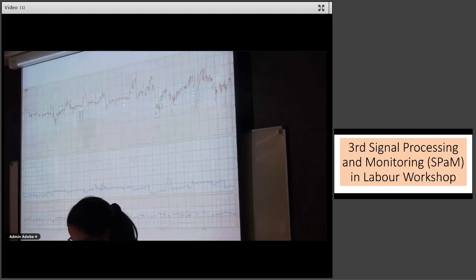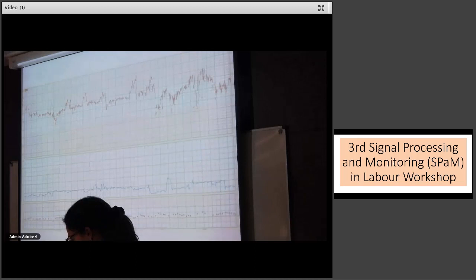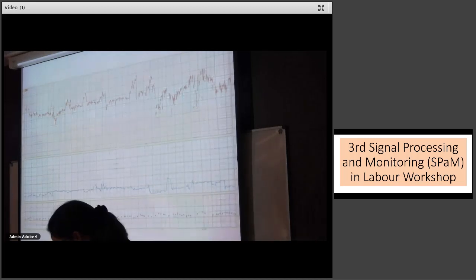Well, I would still be asking the same question for two reasons. One, sometimes mom's heart rates are derived electronically. And I have been a victim of being misled by some of those electronic things, where a mom's heart rate has been the same until one of the midwives put her fingers on her pulse, and then we ended up with almost twice the value that was recorded. So I think there's enough on the trace to make me want to just review the whole thing again. I just find it difficult that a mom will be running a temperature that high and then retain a normal baseline heart rate. But maybe it's the setting, because here we have a lot of epidurals.